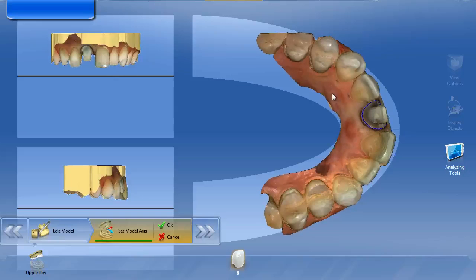Maybe just like this. Okay. You want to also make sure that on this big horseshoe on the right, this little notch here is pretty much lined up with the midline. I'm not going to get too concerned that I can't see everything here. Obviously I can't see any buccal margins. That doesn't concern me. So I've got this lined up left to right pretty good.